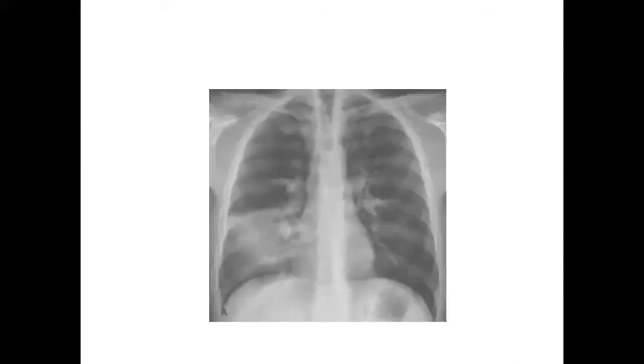Let's just go back one. Now, the doctor came into me and said, "What do you think of this?" I said, "Oh, I think it's bacterial infection. I think it's pneumonia. I think it's airspace shadowing. It's in the right middle lobe." He said, "What type of bacterial infection could it be, doctor?" I said, "Well, it could be gram-negative, gram-positive. It could be community-acquired or hospital-acquired. It could be typical or atypical."